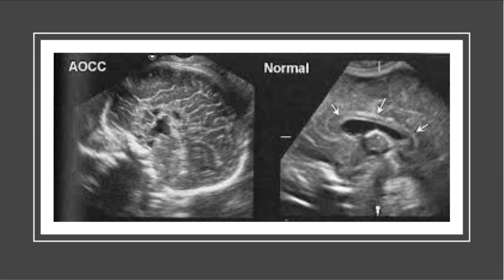So now on the right-hand side, we have our corpus callosum kind of surrounding that third ventricle, right? Nice and pretty. Kind of like an elastic band right around it, and we don't have that on this left-hand side. So we kind of see a portion of the third ventricle, but we don't really see that linear hyperechoic band surrounding it and going around it, right?